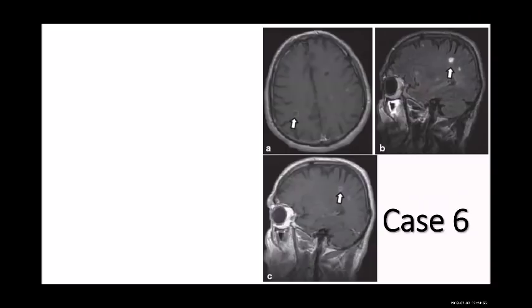Well defined, right? And there's some calcification, I think, but it's well defined, so it's a cyst, right? Either cyst or abscess. There is nothing else that causes that. A tumor will not cause this, it would have an irregular border. Stroke will not cause it. So it's either cyst or abscess.